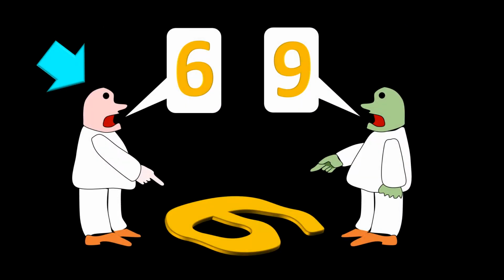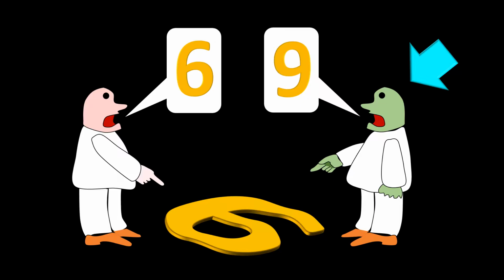Some electroencephalographers use the term encoches frontales when morphologically normal looking encoches have normal spatial or temporal distribution within the recording and normal chronology. For these electroencephalographers, there is no such thing as an abnormal encoche frontale, and waveforms occurring in the frontal region not meeting all the parameters of normalcy are labeled abnormal frontal discharges. Others use the term encoches frontales for morphologically normal looking encoches even if they have abnormal spatial and temporal distributions within the recording, an abnormal chronology, or both. For these electroencephalographers, there is such a thing as an abnormal encoche frontale.